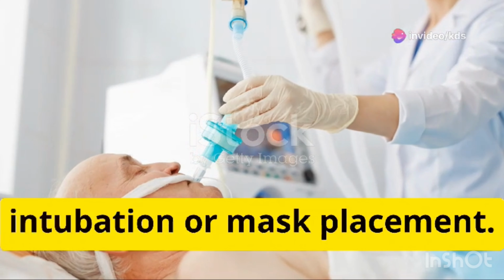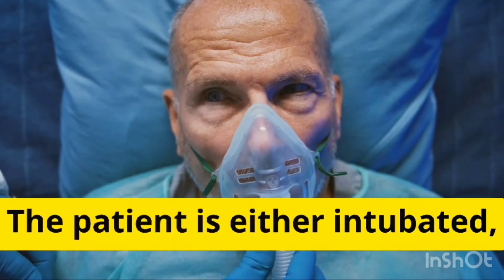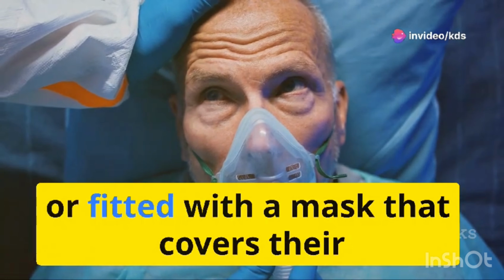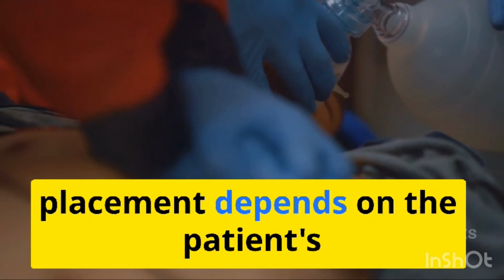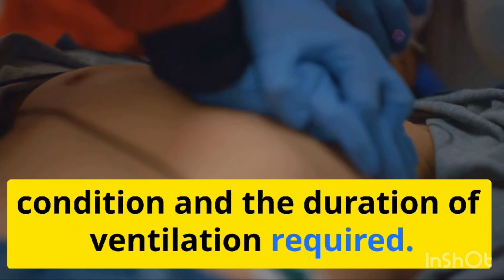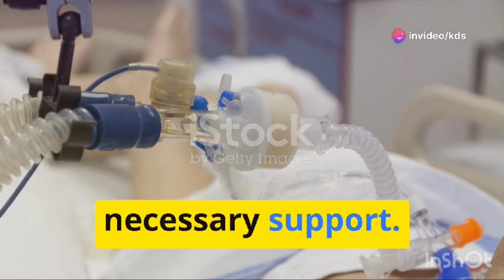Then, intubation or mask placement. This step is critical for establishing a secure airway. The patient is either intubated, which involves inserting a tube into the windpipe, or fitted with a mask that covers their nose and mouth. The choice between intubation and mask placement depends on the patient's condition and the duration of ventilation required. This creates a secure airway for ventilation, ensuring that the patient receives the necessary support.